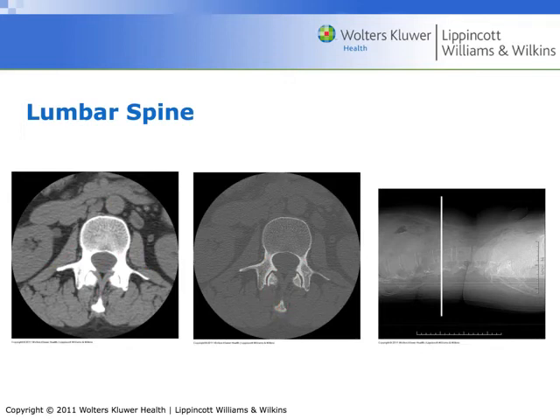That is the spinous process of L1. So dipping down, we can see it coming down into these images. That's the L1 spinous process. This is the transverse process of L2. Erector spinae muscles. On either side, these soft tissue structures here are the kidneys. And this long line here is the small bowel, the jejunum, or perhaps the ileum.